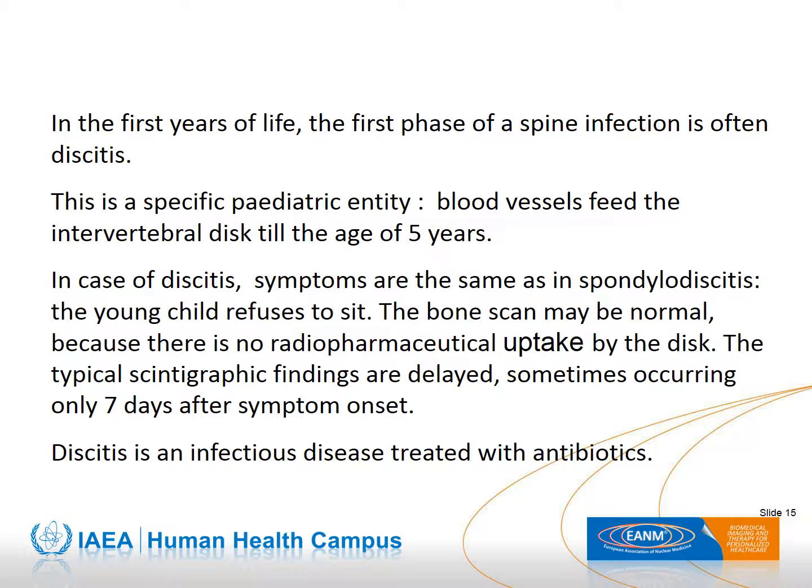A bone scan may be normal due to a lack of radiopharmaceutical uptake in the disc. The typical scintigraphic findings sometimes occur only 7 days after symptom onset. Discitis is treated with antibiotics.